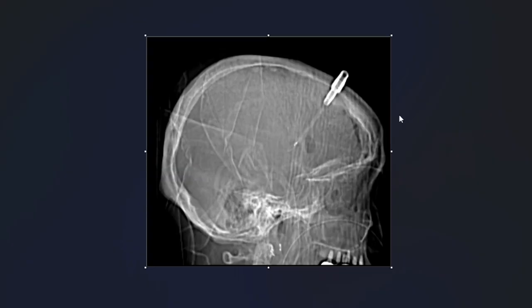And so on the scout image, we see this sort of device that's overlying here, that's catching my eye, and then it looks kind of busy up here in terms of density and lucencies, a little hard to make sense of. And I see this kind of tube going down this way. It's above the oral cavity, so it's some sort of nasogastric or maybe even a nasal intubation tube. But anyway, we'll focus on the intracranial abnormality.